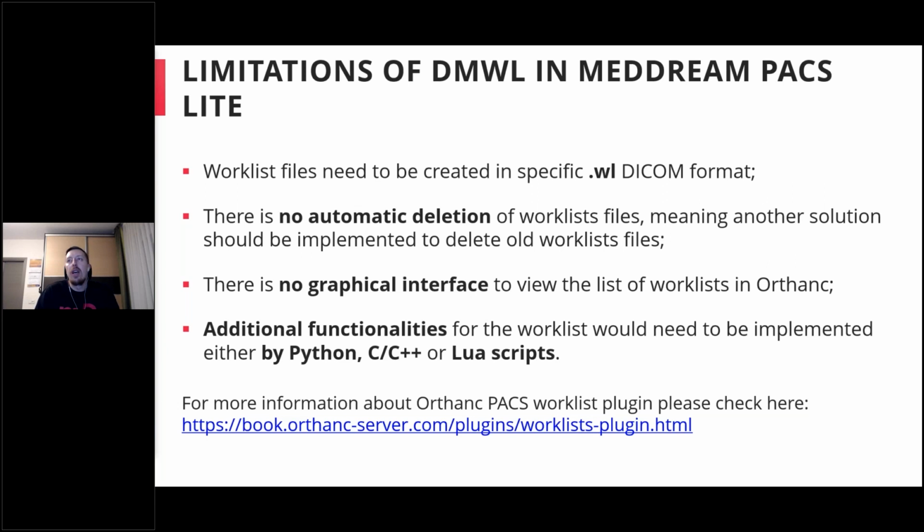So basically, you would also need some kind of solution which would delete the older worklists. Let's say today you have 100 worklists, tomorrow you will have another 100, so totally it will be 200 files in that folder. Ideally you would want to delete these worklist files when, for example, the order is completed and the exam comes to the PACS, so the radiologist wouldn't see that worklist in his list on the device, because it has already been performed.